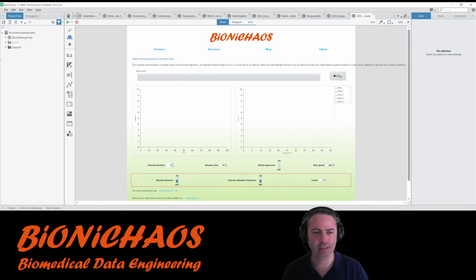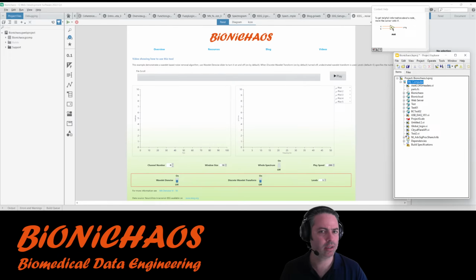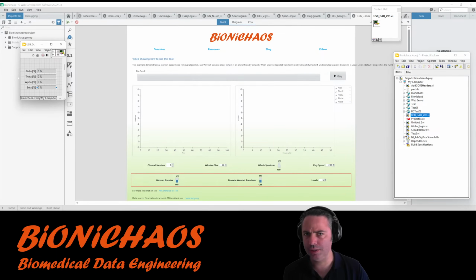Back to the side. Another important thing is that I normally record my own EEG when we have more than 3 or 4 viewers of the stream. Then I display my own EEG in a separate window.